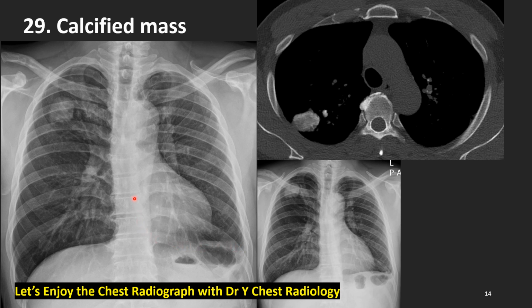And also we see the left side lung is smaller than the right side and deformed with smaller intercostal space than the right side. He's been the same for a long time. For a long time it has not changed.